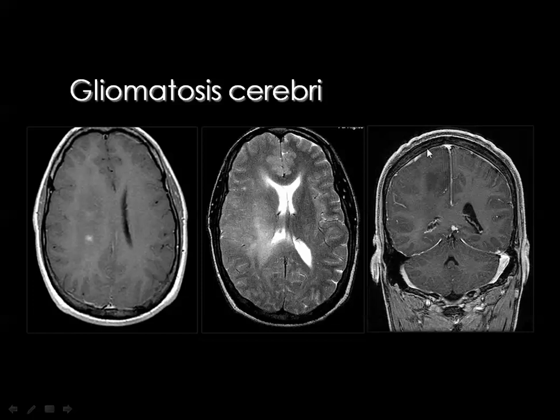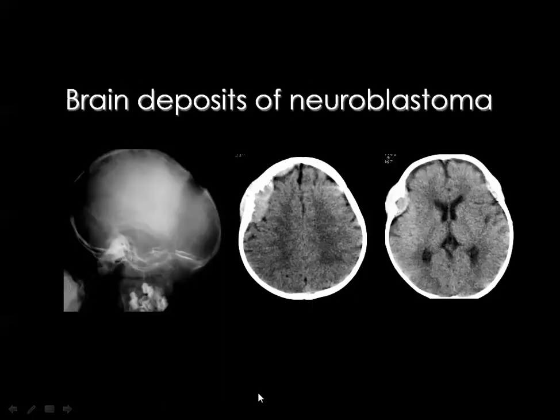Metastases in the pediatric brain are not commonly seen like those metastatic deposits in adults, but in cases of neuroblastoma, for example, which is one of the lesions commonly seen in children, the metastatic deposits have certain definitive criteria, being located at the suture line, and they result in marked widening of the suture. And in these areas, you see a mass which is most likely homogeneously enhancing.